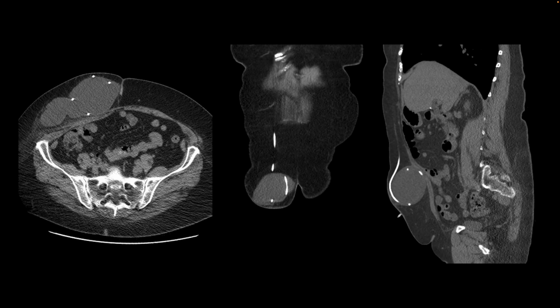This is our next patient. They presented with an abdominal swelling, and a few days before the swelling appeared, they had a procedure where a VP shunt, ventriculoperitoneal shunt, was placed, and we can see part of the shunt catheter here on this coronal image from their CT of the abdomen and pelvis, also on the sagittal image. And then we find that it coils in the anterior abdominal wall subcutaneous space right there and here without ever entering into the intraperitoneal compartment.